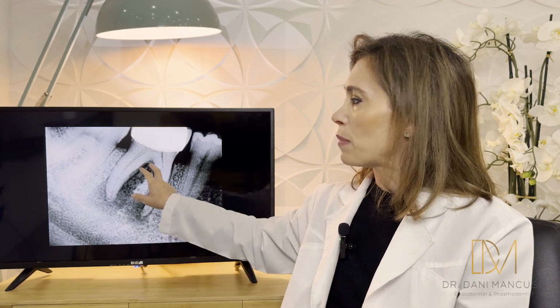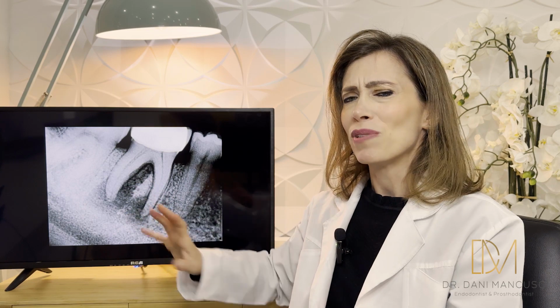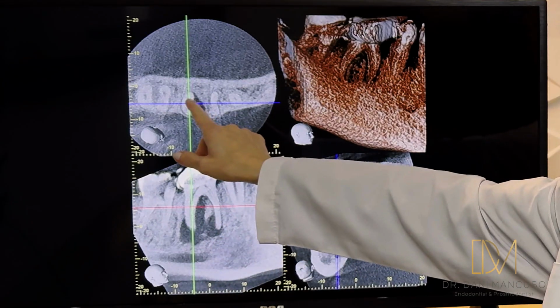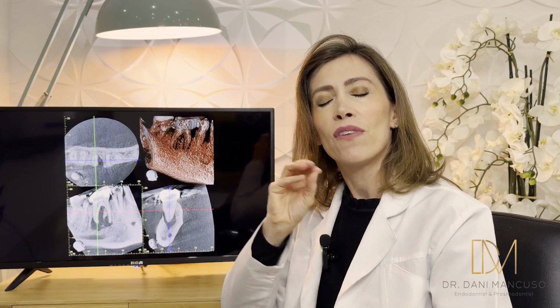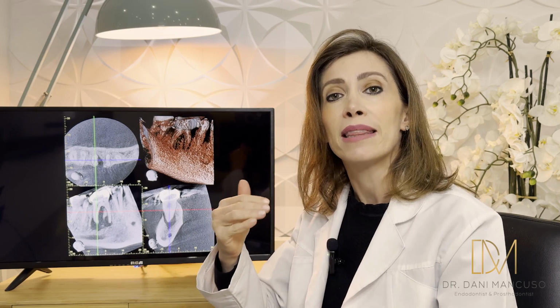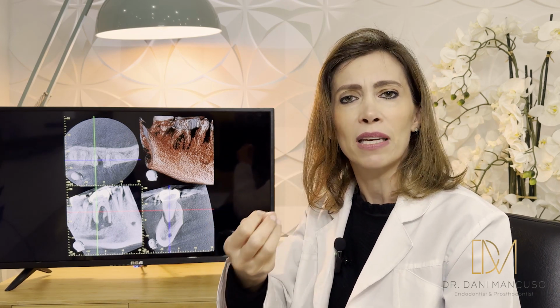But intriguingly, when we see that image, we say, oh wow, the furcation is involved. But when we had a closer look, the CBCT showed what was happening in that area. It's very important to take a CBCT, because it changes completely the way you think about the case.